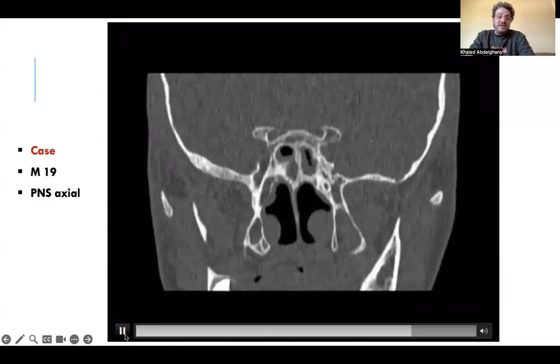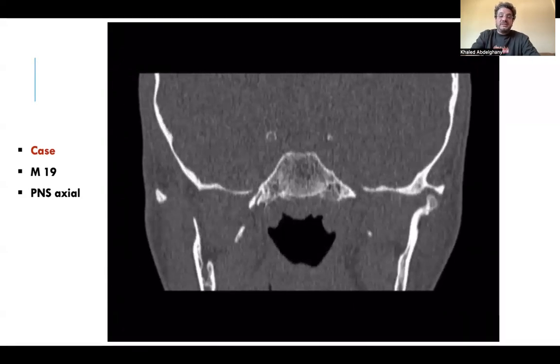So the aim of this case is that sinopulmonary infection has reasons to be mentioned in HRCT. If upper lobes and this appearance, your diagnosis will be cystic fibrosis. Lower lobar predilection, you have three differentials. Primary ciliary dyskinesia, because no dextrocardia to be Kartagener at that time, it will exclude the primary immunodeficiency and Young syndrome. The levocardia and normal situs for the patient. So we have three differentials: primary immunodeficiency, primary ciliary dyskinesia, and Young syndrome. And thanks for your attention.